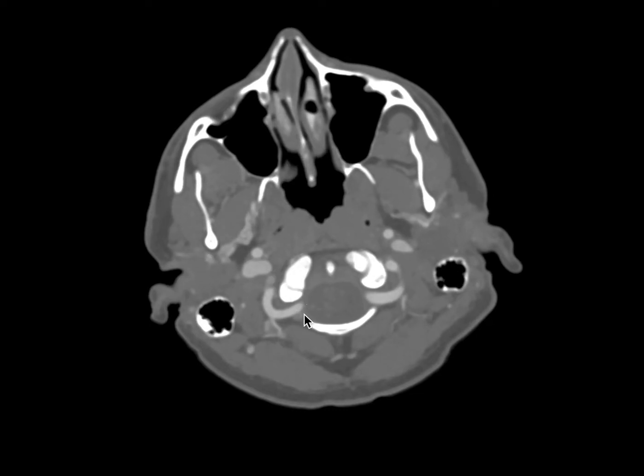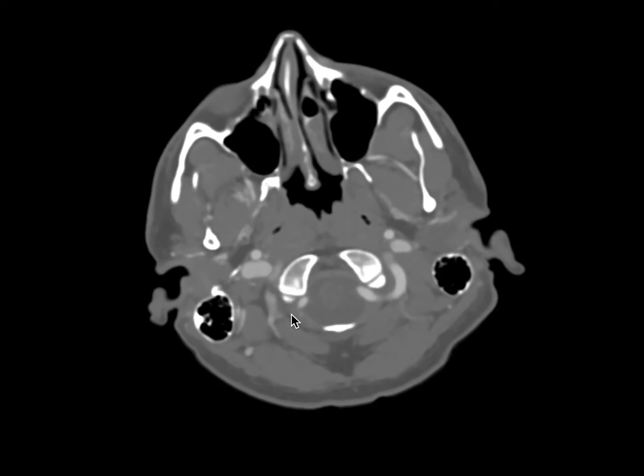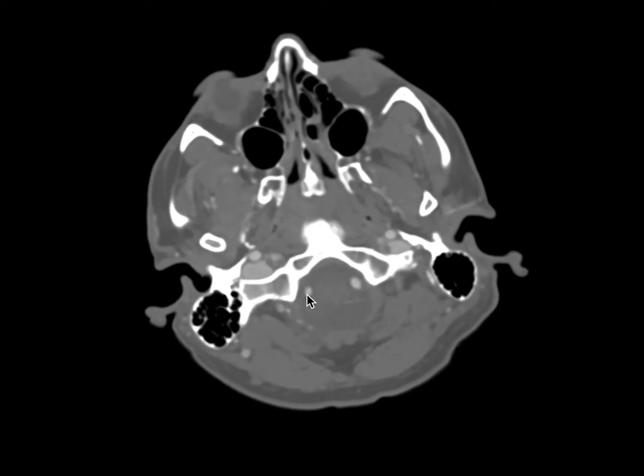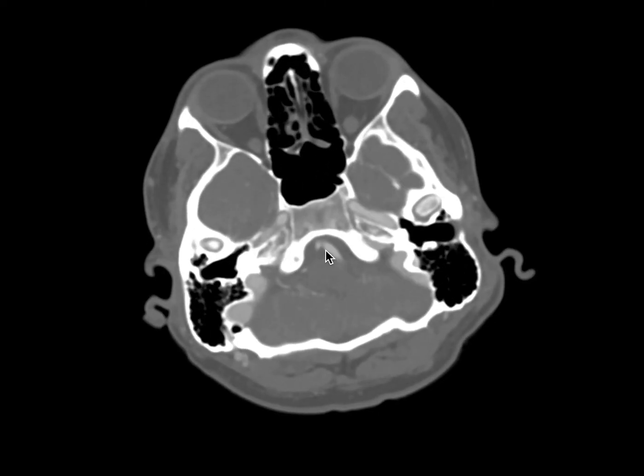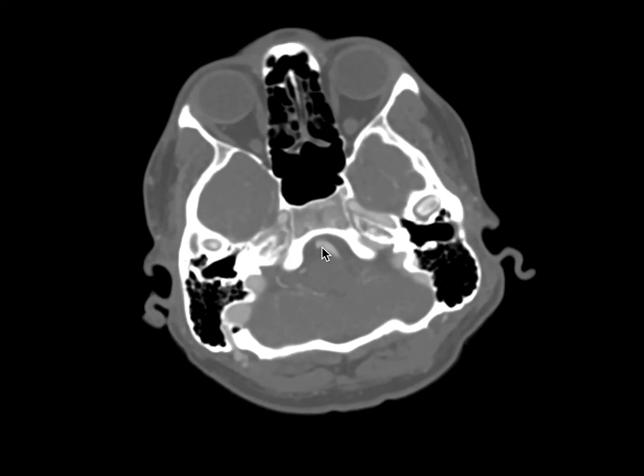Sometimes you can have a bony bridge when there's calcification of the posterior atlanto-occipital membrane here, and this is called an arcuate foramen. As it continues medially here, it will enter the dura and become the V4 or intradural segment. This is sometimes also called the intracranial segment. The V4 segment continues up until it meets the contralateral vertebral artery to become the basilar artery.